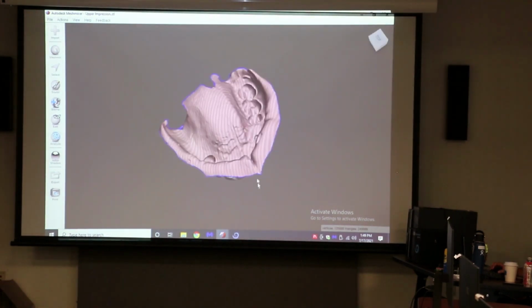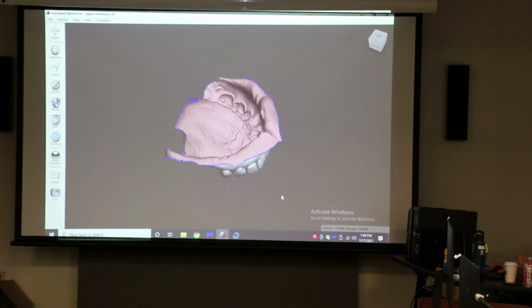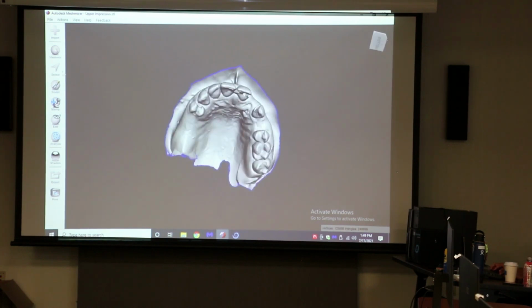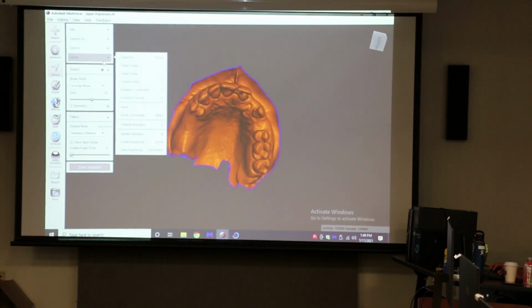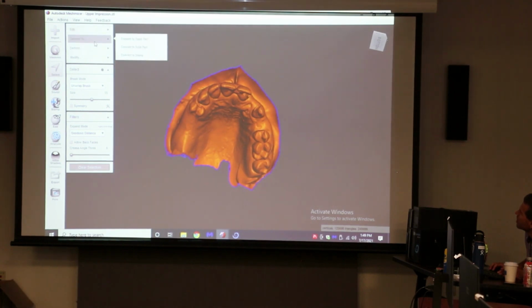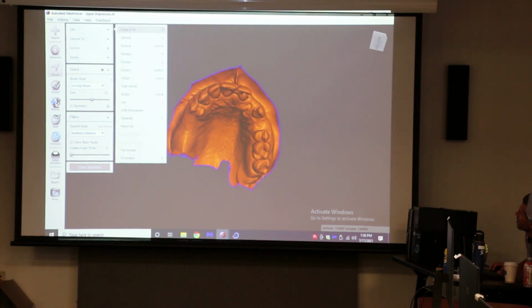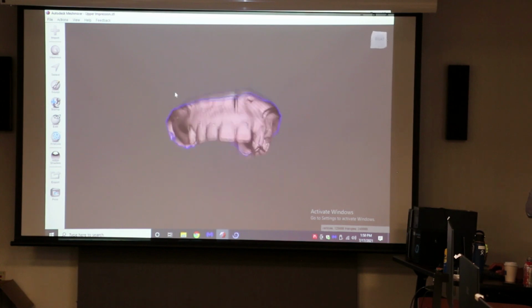So watch this. In Mesh Mixer, it actually knows which is the active surface, right? Yeah. So if I select and double click this whole model here, and I go to modify, the term is called flip normals. Am I missing that? Edit. Could be polarity too. Yeah, there it was, under edit. Flip normals at the bottom. So when you flip normals, now do you see what it did?